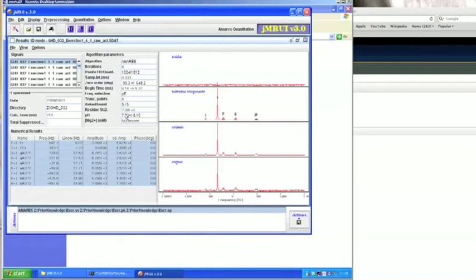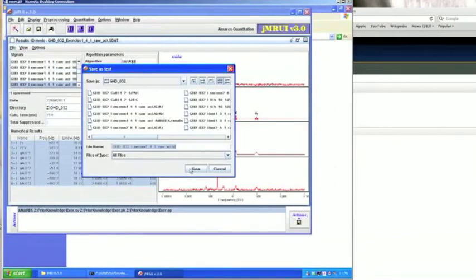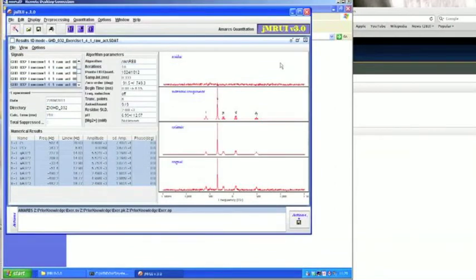So that's now calculated. You can see a pH is here. That's present for all the different exercises, the same exercise of 63 minutes of exercise rather. You want to save all as text, and you want to save it in the same folder. So you just click save there. That's done. It takes a minute or two to save that.